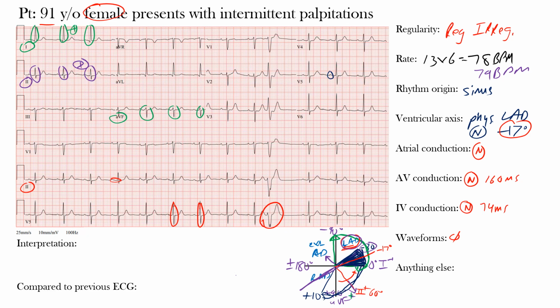Normally, R wave amplitude should progressively increase from leads V1 through V5, which is for the most part seen here. Okay, so notice that our R waves here are slowly increasing in amplitude. All right, maybe not so much from V3 to V4, but overall, we would probably consider this a normal R wave progression.